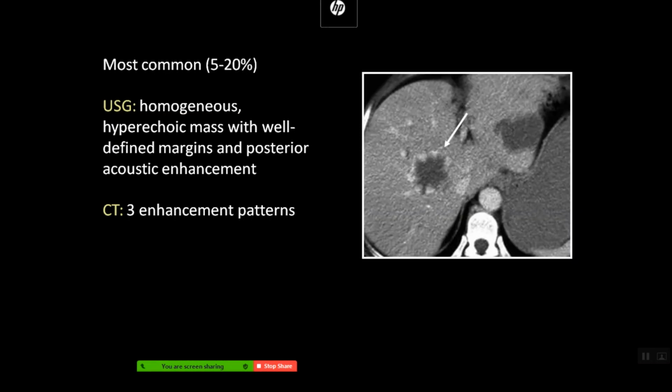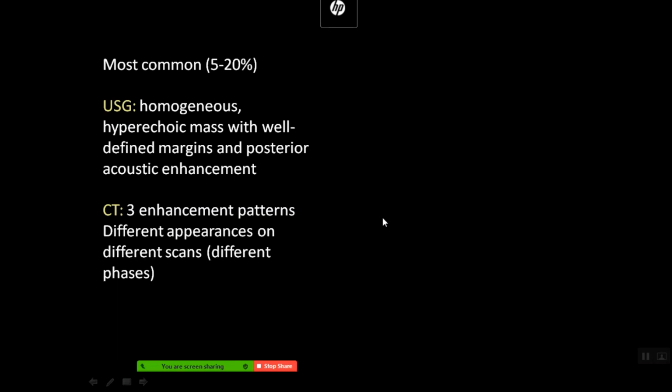Okay. Alright. So these are 3 enhancement patterns. Okay. Right. So this is your peripheral discontinuous nodular. This is a better image, right? So peripheral discontinuous. You can see it's discontinuous nodular enhancement, and then centripetal to fill in. Okay. Yeah. Another thing is in Tata you will also see multiple scans of the same patient, right?